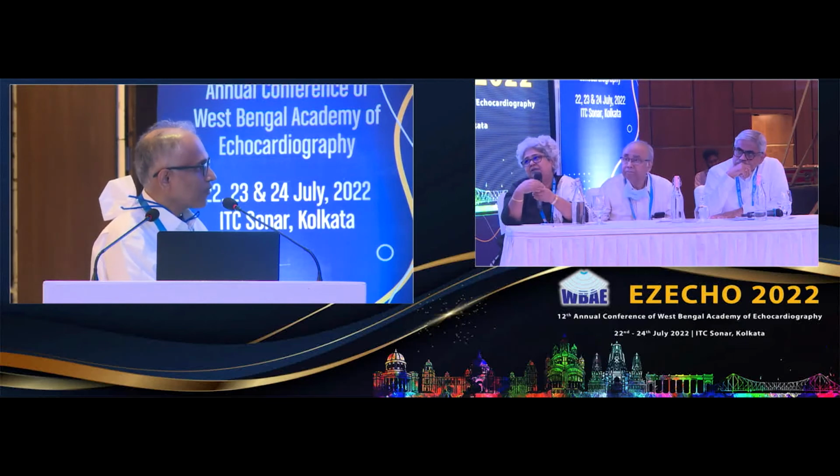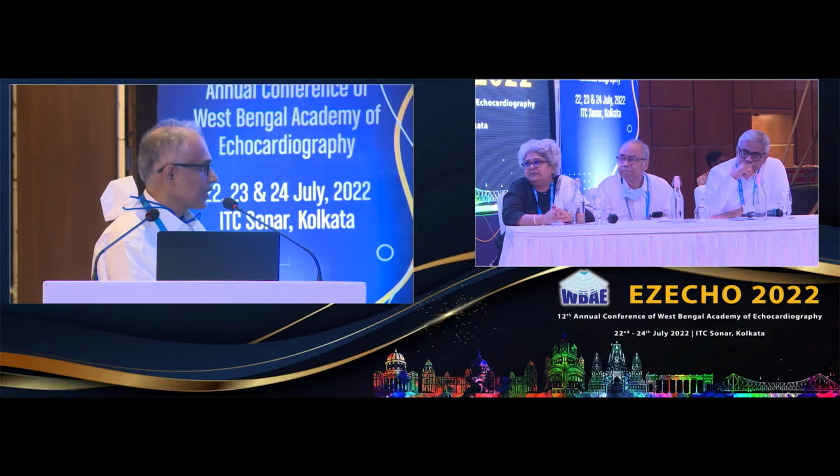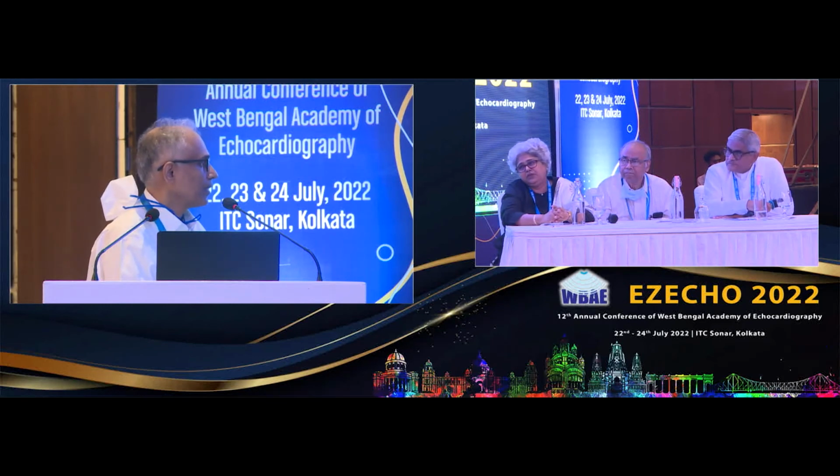One is that over a period of time, the myocardium also improves. The other way of looking at it is just looking at the strain itself. If you look at the strain and you can see an improvement in the lateral wall, you know that the tethering is gone and there is improvement. And then, of course, the other signs will also start to come down. So one can look at the traditional points as well as the strain itself, to see how the myocardium and the tethering have improved. It gives you an impression.